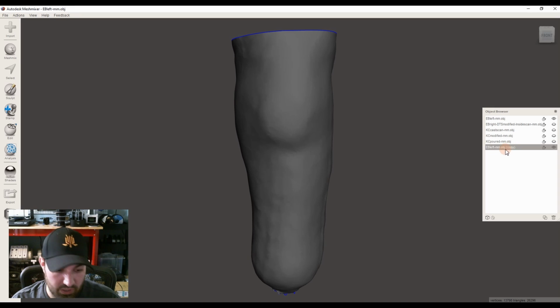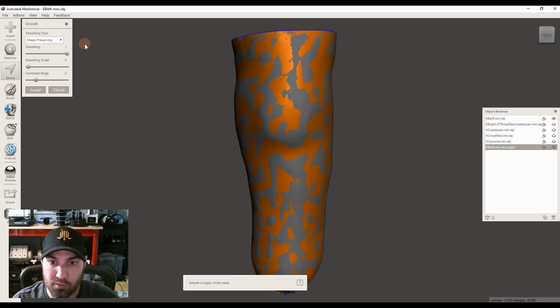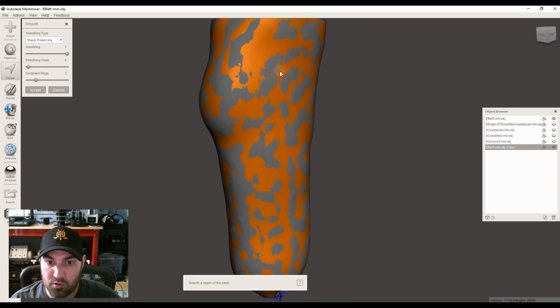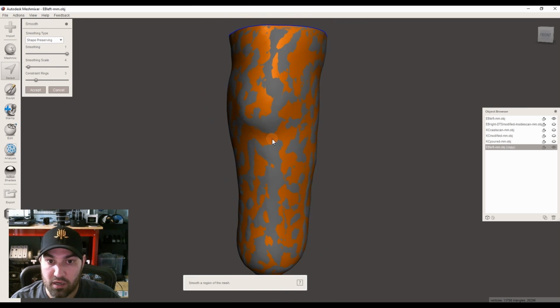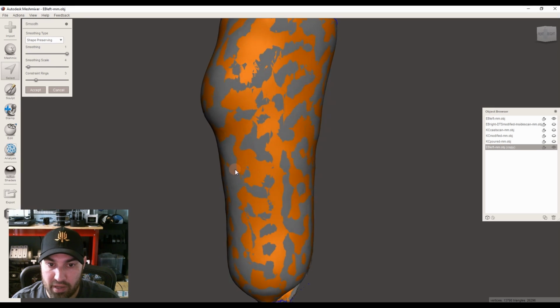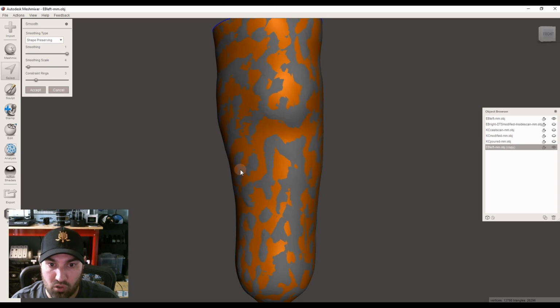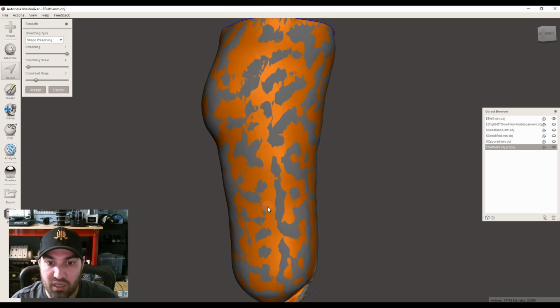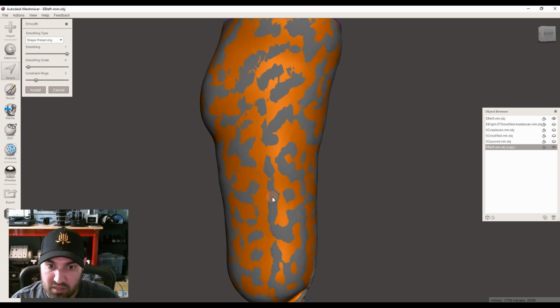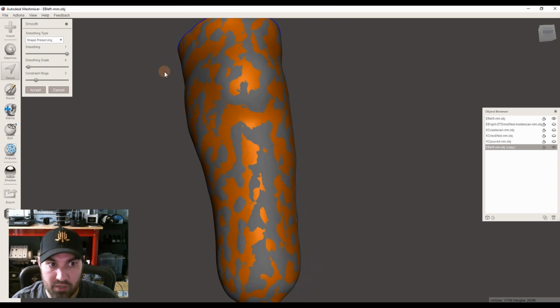on this new one. If we hit Control A there and deform and smooth, you can see how it now shows us the current model being smoothed in orange, and it also shows us that base model. So anytime it's kind of modeled looking like this, in and out of each other, that's a good thing. That means that you're smoothing it without making any major changes anywhere.